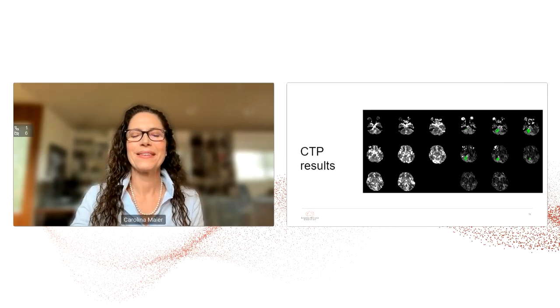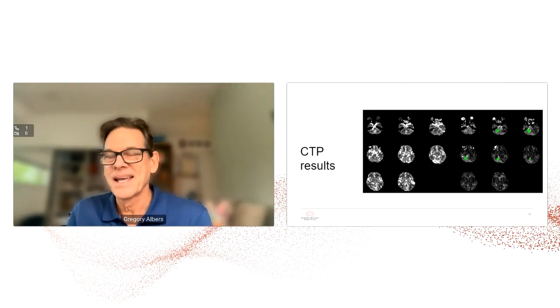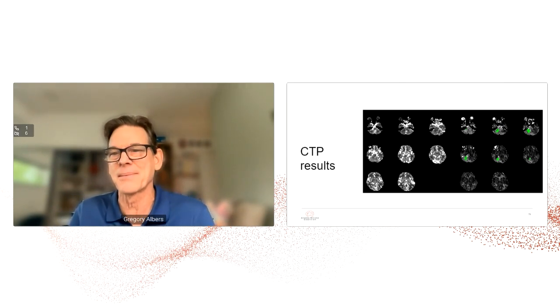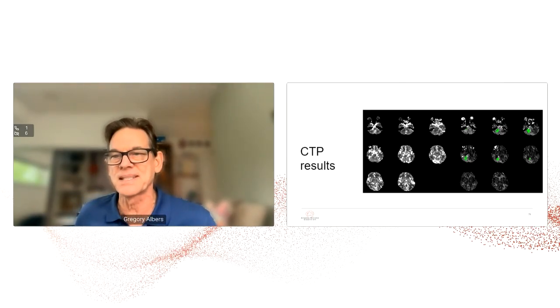Yeah, this is a tough case. And as mentioned, we see this all the time, that people come in, it looks like it's peripheral vertigo, and you don't want to miss a cerebellar stroke, because a cerebellar stroke can swell up and compress the fourth ventricle. They can be back in a couple of days with hydrocephalus. So it's a gigantic medical legal issue as well as a clinical one to sort these out.